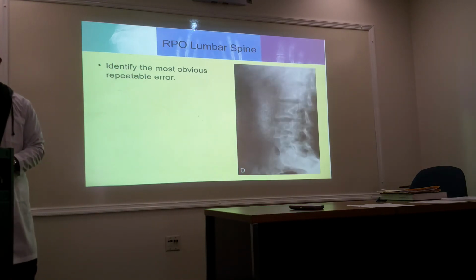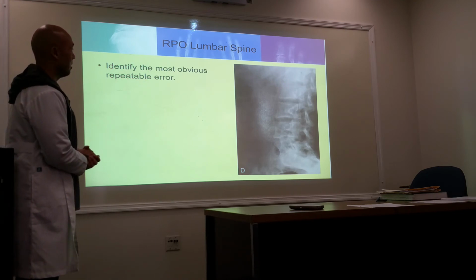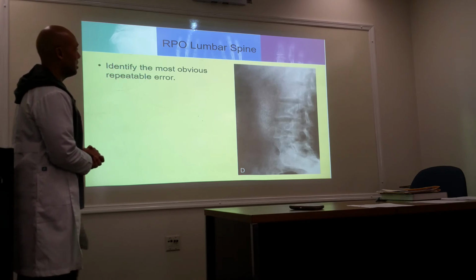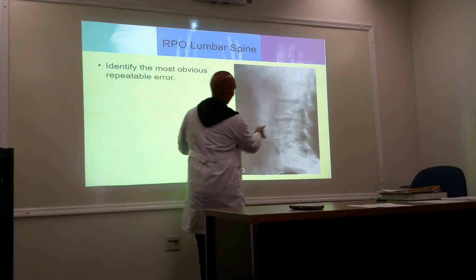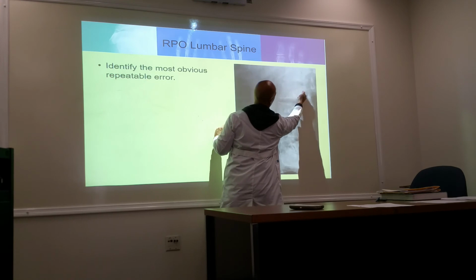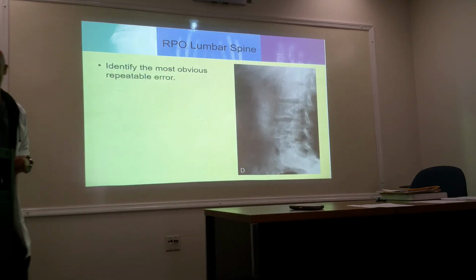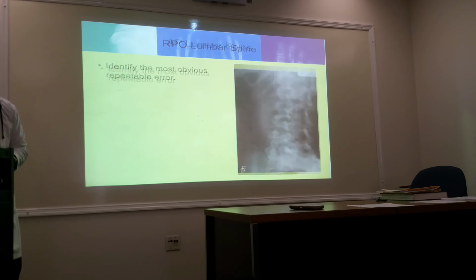How about this one? Very long. So yes, I agree, centering. There's some motion going on. It's rotated. Over rotated. Why do we say it's over rotated? Because where are the eyes? Eyes are towards the back. We're not even seeing the eyes here, but I'm sure they're back here somewhere. So that's over rotated. Everybody agree? Okay, let's call it over rotation.